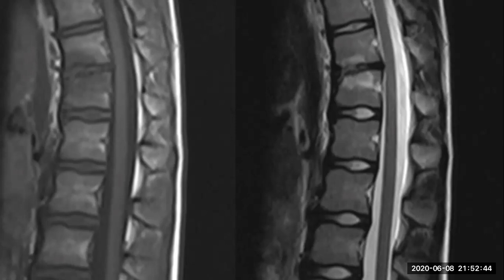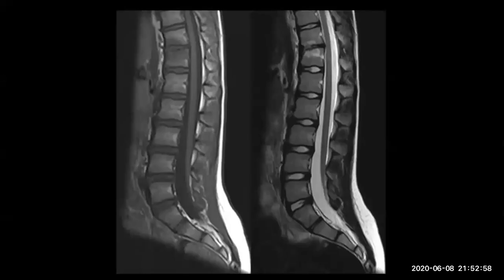Okay, this is a patient with tethered cord, as you said. It is ending at the level of S1, and there are also changes at T11 and T12, probably not infection because the patient has no signs of infection. Could be Schmorl node or Scheuermann disease.